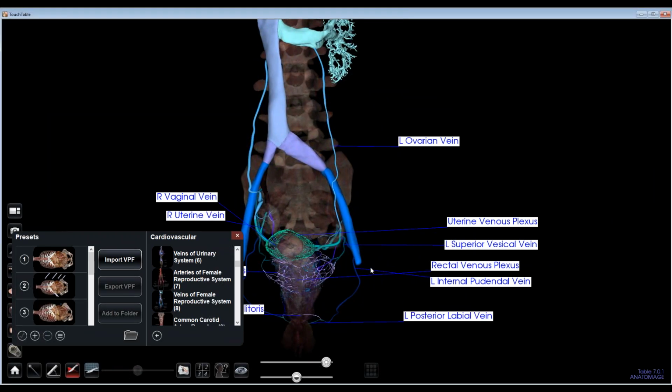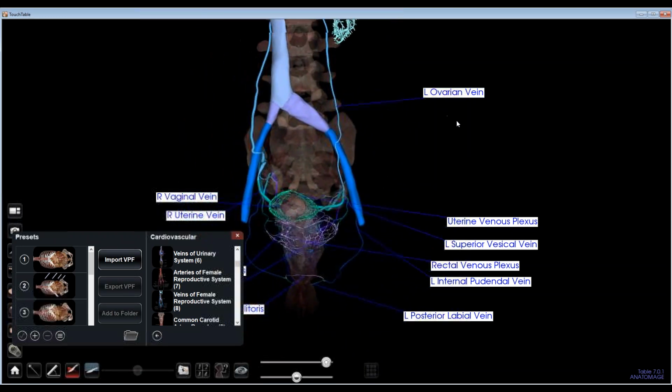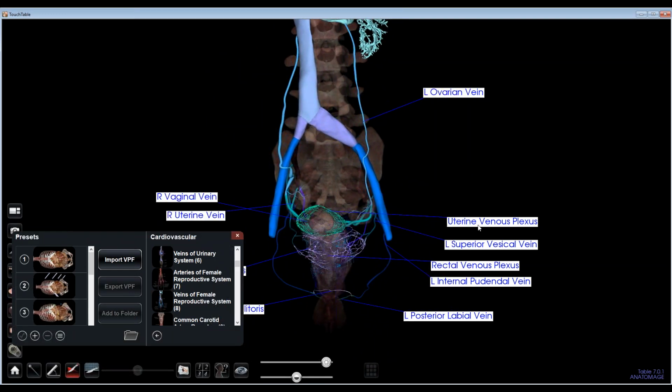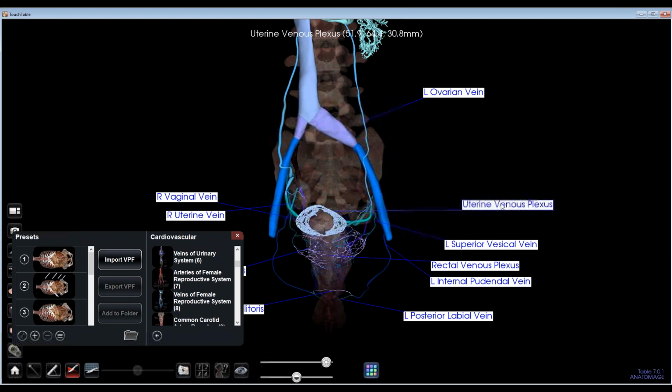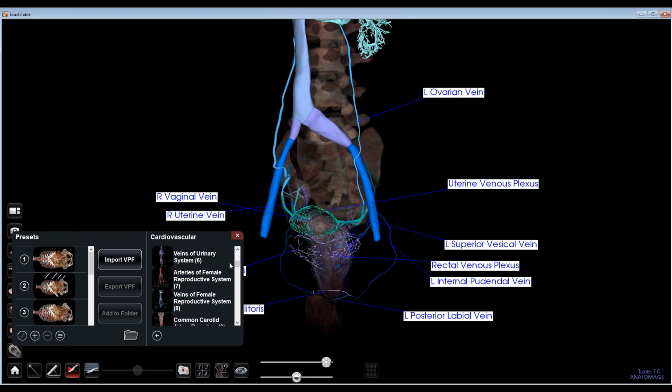And a note about the annotations, if you actually click on an annotation and drag it around where you place it, it'll actually freeze into that location. So notice none of these are moving, they're fixed on the screen. So that's why that's the case. That's saved with the preset, but if you were to create your own annotations or modify your own views, click, drag these around, and then they'll sit at that fixed position.